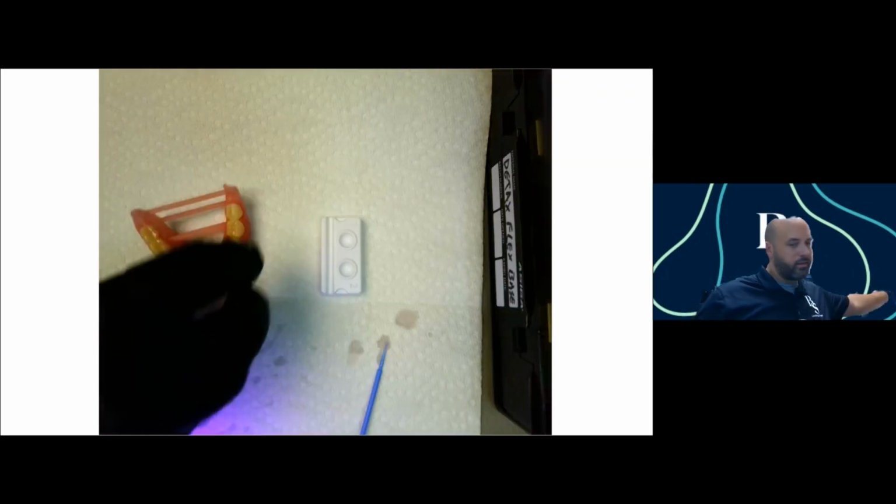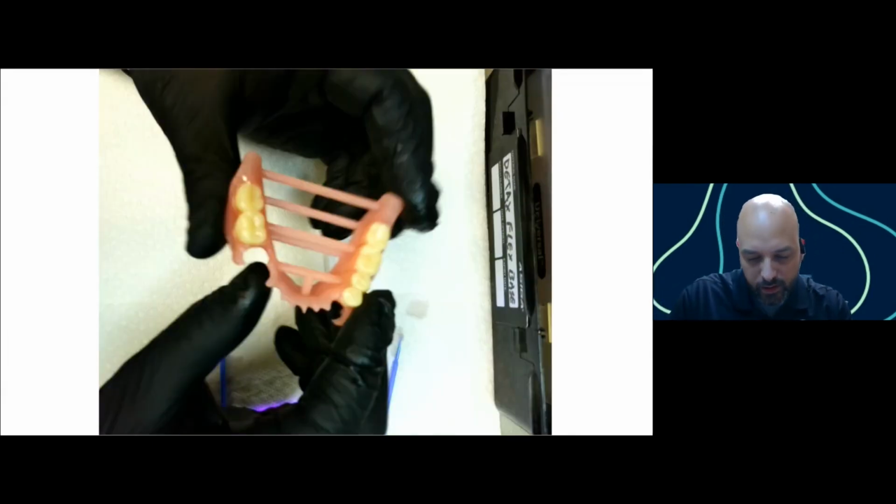And then one of the last things I like to do is I like to take a paper towel and kind of clean up around the base as much as I can to get some of the excess off that way as well, especially down in the central grooves of the teeth. Sometimes, if you put too much on there, it can get a little heavy. So now that's all done. I'm going to tack cure the lingual.